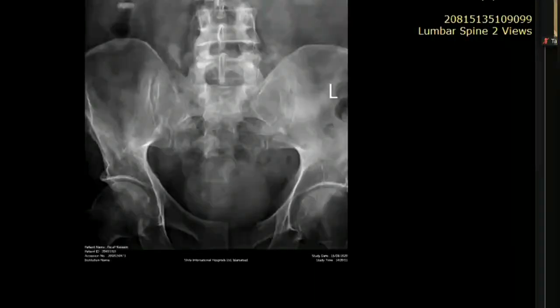This is an X-ray lower abdomen and pelvis of a skeletally mature patient. I can see some metallic density or hyperdense areas in the right lower quadrant. You can ignore those. That's an incidental finding. Okay.